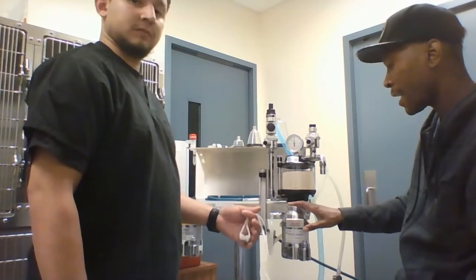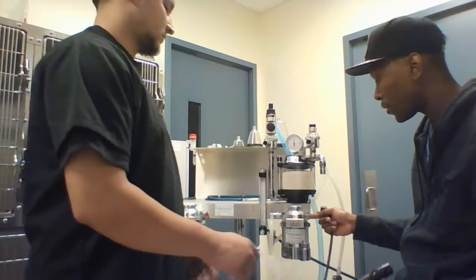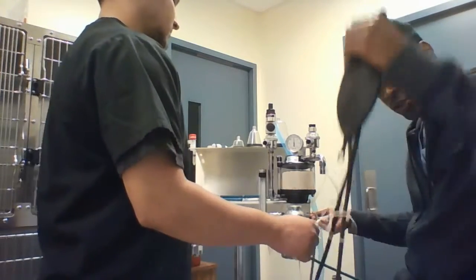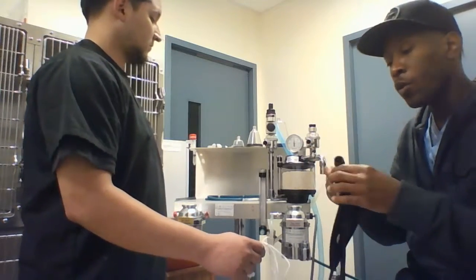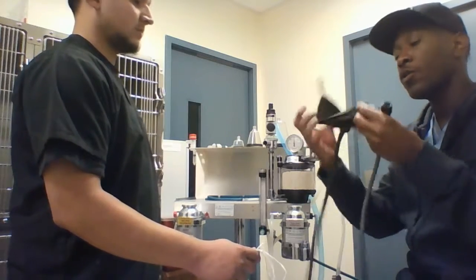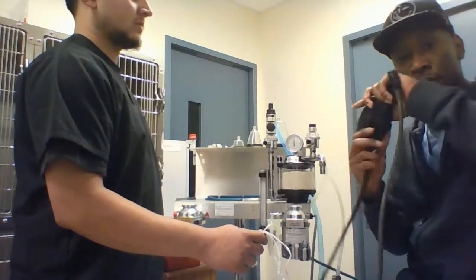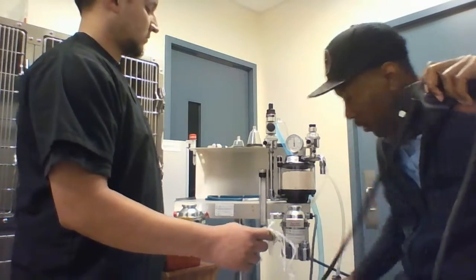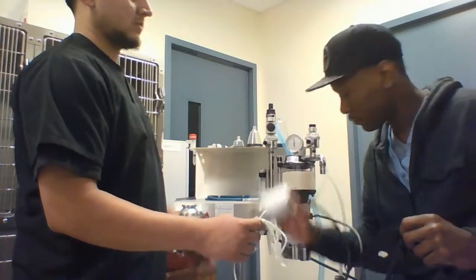Once your anesthetic gas and oxygen have mixed in the vaporizer, they will leave the vaporizer through the vaporizer outlet port, through the breathing circuit, which is connected to our patient through the ET tube. Once our patient inhales and exhales, it fills the reservoir bag, where our anesthetic gas, along with oxygen and carbon dioxide, will travel through the semi-permeable membrane down to our F-air canister, where all anesthetic gas will be removed for personnel.